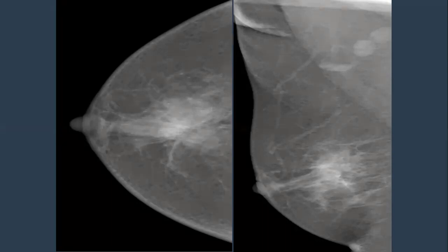And skin thickening, band-like, extending to the nipple with subtle nipple retraction on MLO. Look at the skin thickening. Look for the nipple here. Axillary lymphadenopathy. Yes, and there are lymph nodes that are relatively suspicious, lacking the hilum. This one demonstrates the hilum, while the others are lacking, and this even demonstrates minimal perinodal edema.